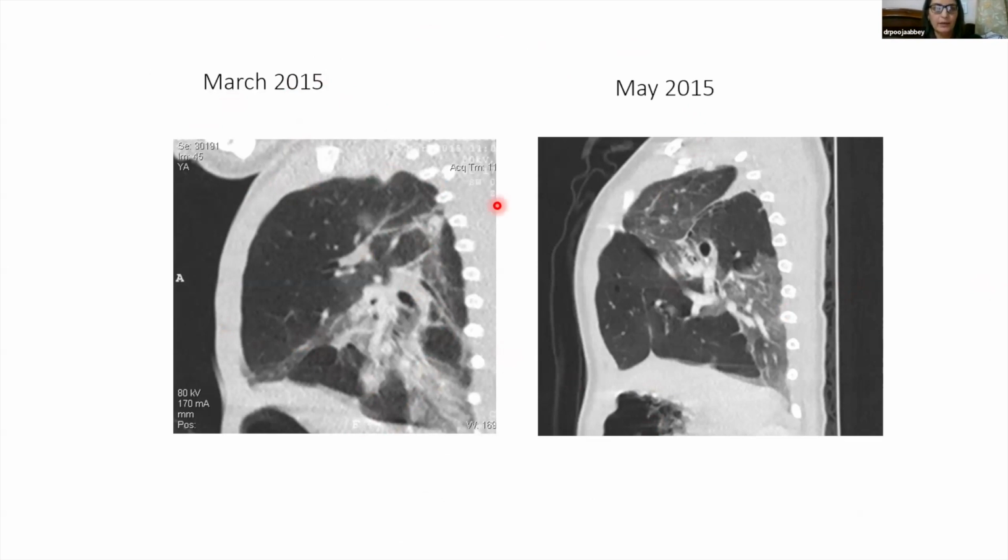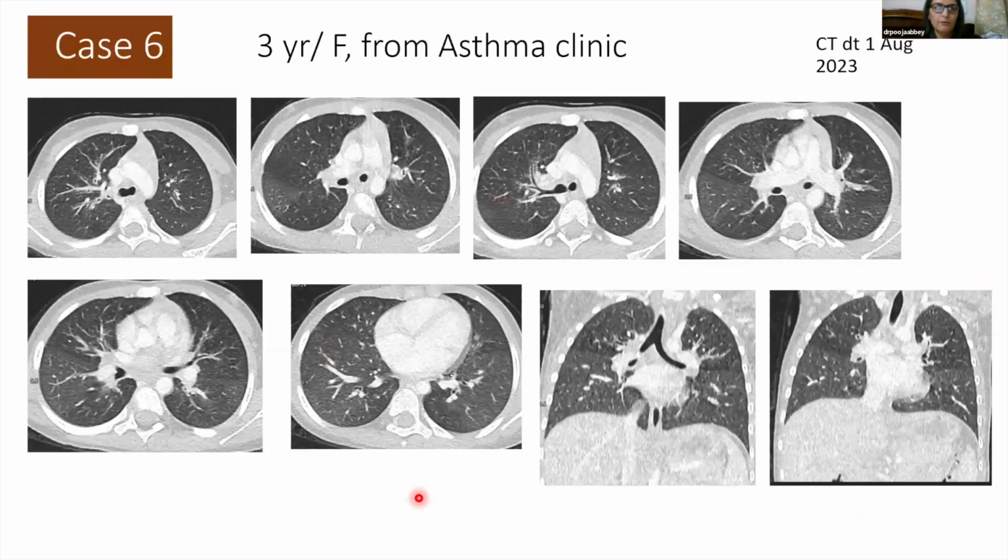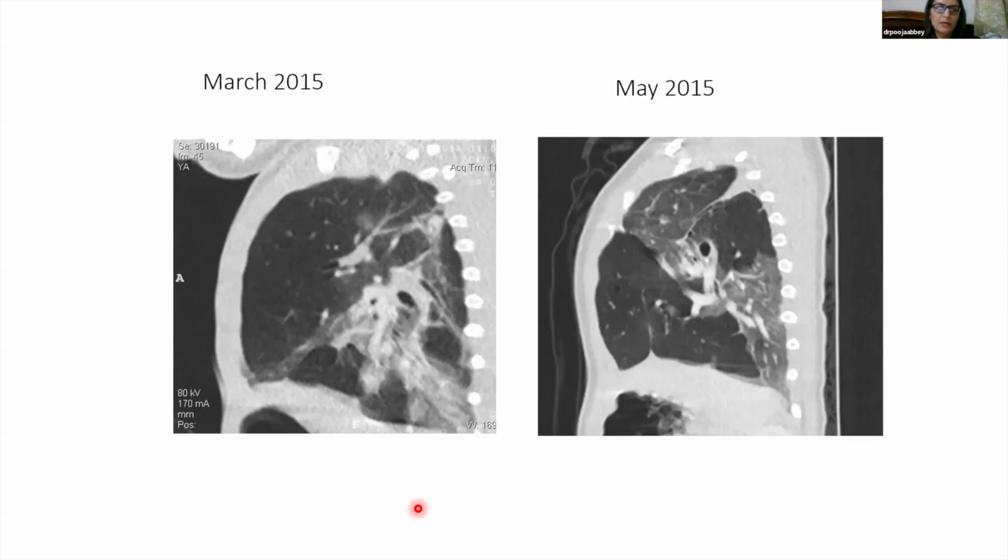We need to be a little more careful, especially in congenital lung anomalies, and in everything really. Look at everything, once you think you've made the diagnosis. That's what probably happened. We were very happy that okay, it's a congenital overinflation of the upper lobe, and that's it. And we missed out on something which actually had great implications for the management of this child, because after surgery, the symptoms happened again.